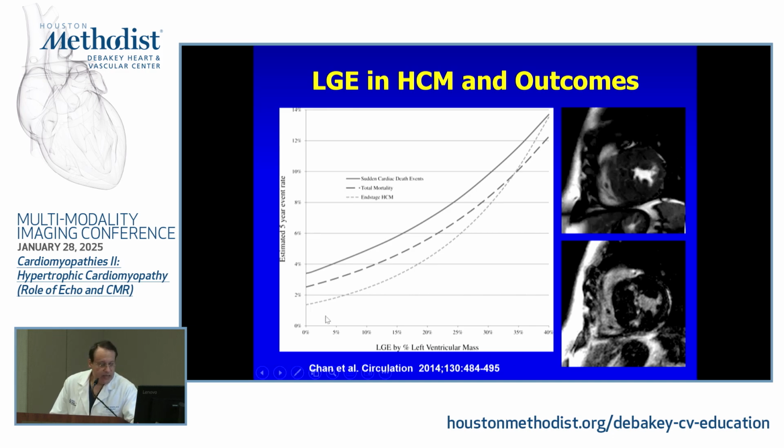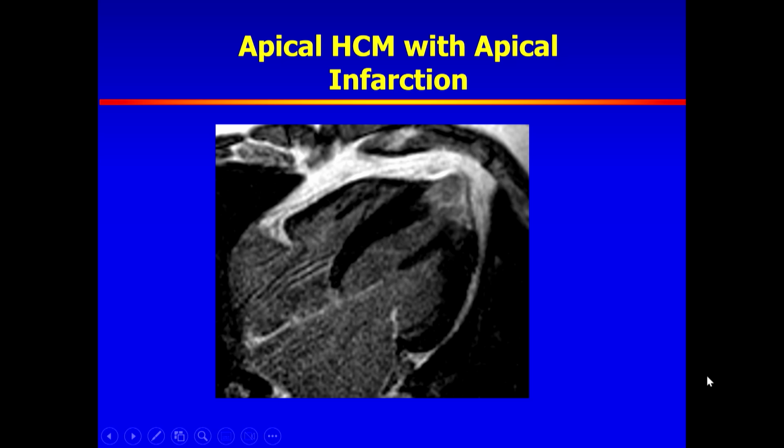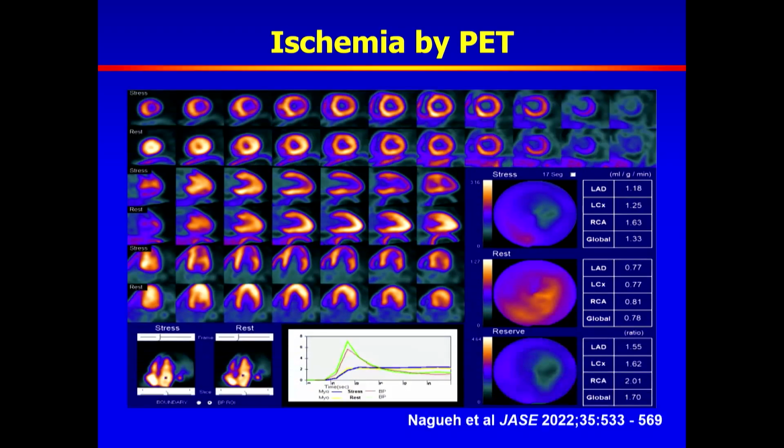LGE and its association with sudden cardiac death, with total mortality as well as end-stage cardiomyopathy. I won't dwell on that. Example of an apical infarction recognized with LGE by CMR.